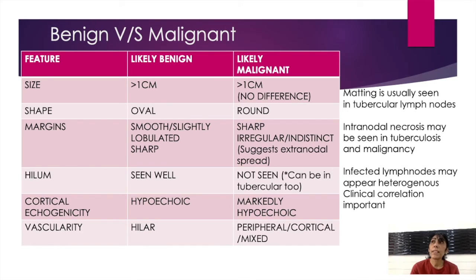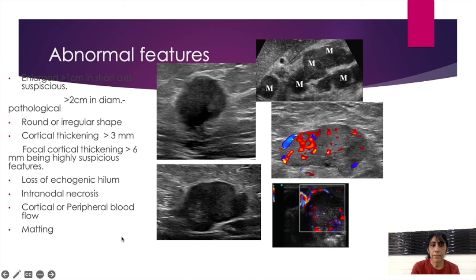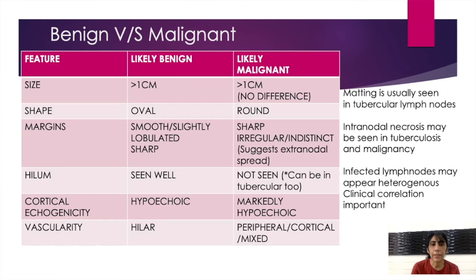When you see carefully, then only you are able to see there are some echoes in it, plus no enhancement is seen, so likely this is a markedly hypoechoic area. Like this one which you see here, this is markedly hypoechoic. Even these look dark, but these are not. So that is why I said that criteria is not fixed, but yes, some favor malignant, some favor benign.